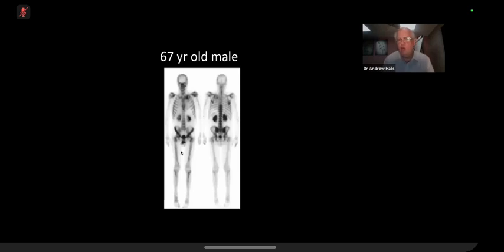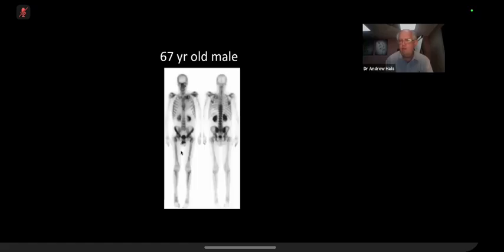That's not what we're looking at. I mean, the patient might have had an upper chest mass. What I'm really looking at is the result of some treatment of malignancy. Can you see what treatment this person has had? I'm seeing increased uptake within the kidneys bilaterally and also along the iliac crest. I'm not sure where exactly the cure may have been, actually.